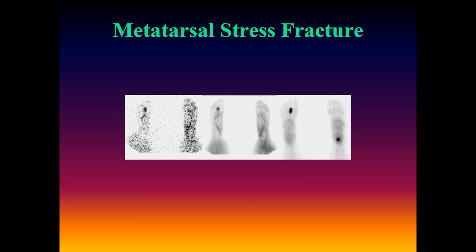This is an example of a metatarsal stress fracture involving the second metatarsal of the right foot. There's focal hyperperfusion, focal hyperemia, and focally increased uptake in that bone on the skeletal phase.